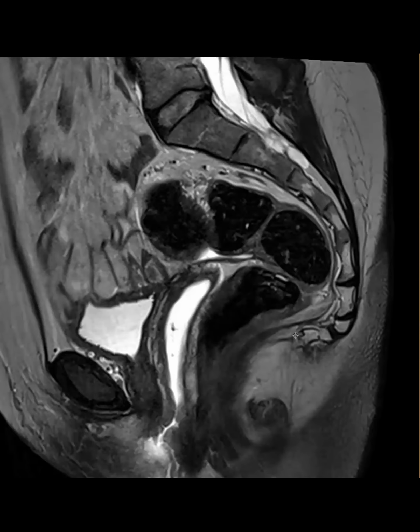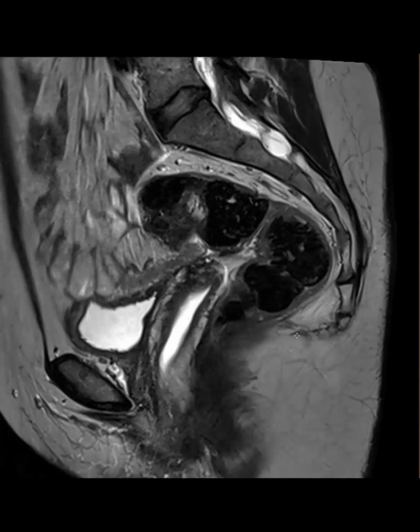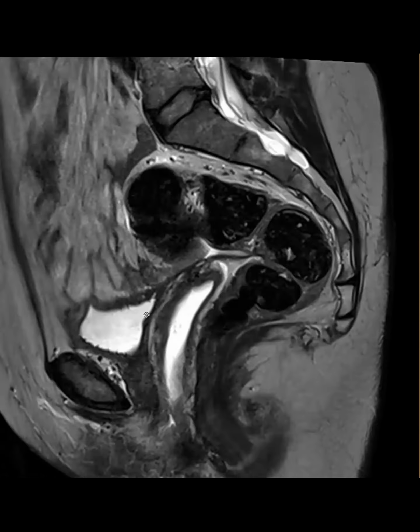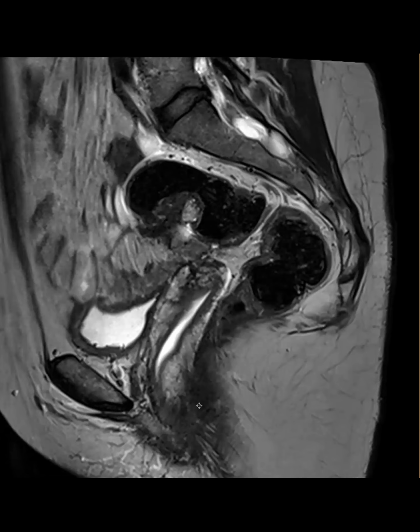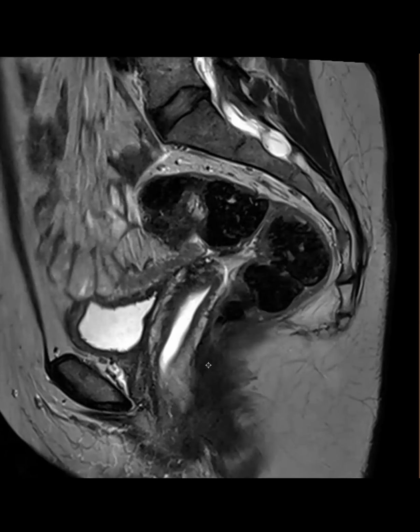Wait, is that another mushroom cap? Okay, where? On the rectosigmoid junction there? Wait, hold on. Whoa, sorry. What were you referring to? That thing there, but wait, is this a male or female? It's a woman. Scroll through. Okay. Hysterectomy. And I see the vaginal canal. Okay. And then scroll through the rectosigmoid. I thought I saw a mushroom cap right there. Yeah, good. What else?